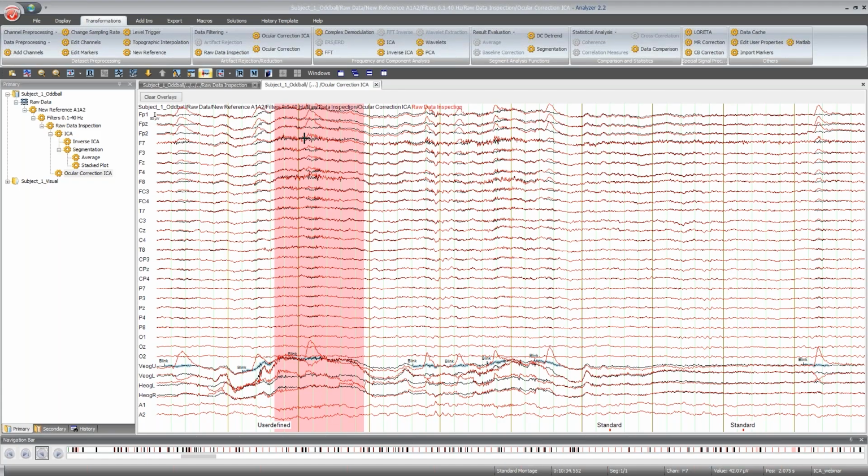And also the data points and thereby the bad intervals do not play a role in this matrix once it's computed. And if we back project the data, we multiply this matrix with all data points in there, and we do not take out the data points in the bad intervals actually. So this matrix is still multiplied with all data points. And that's why you see also deviation in here.